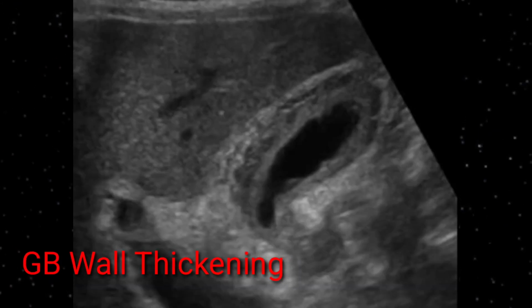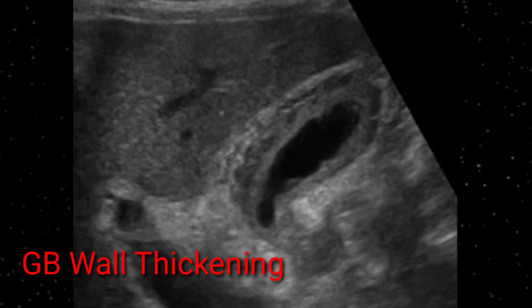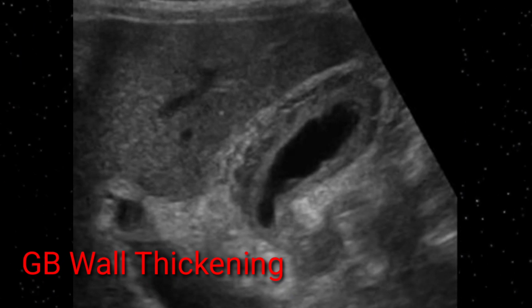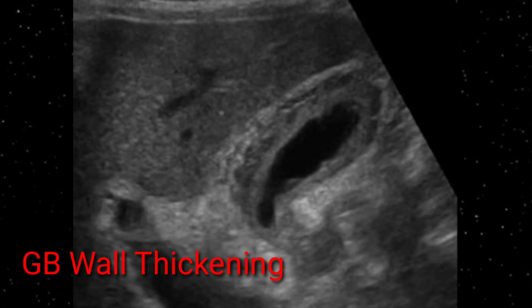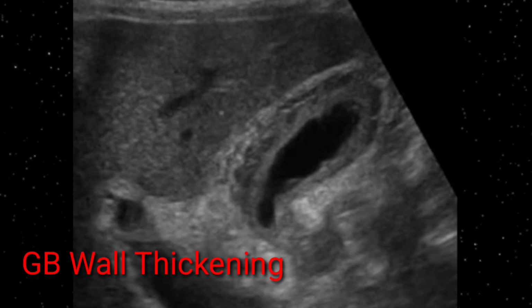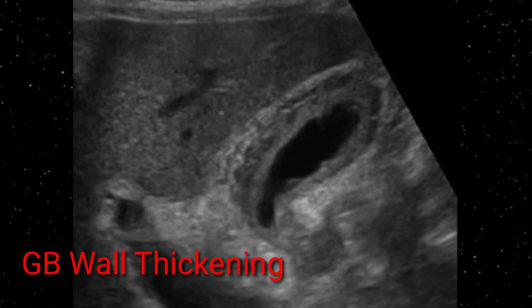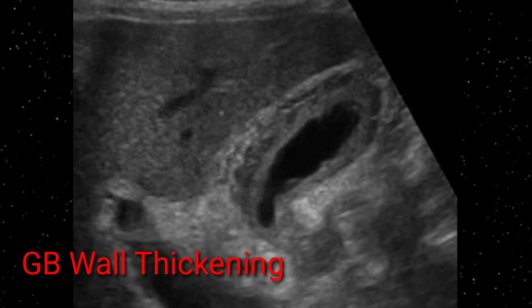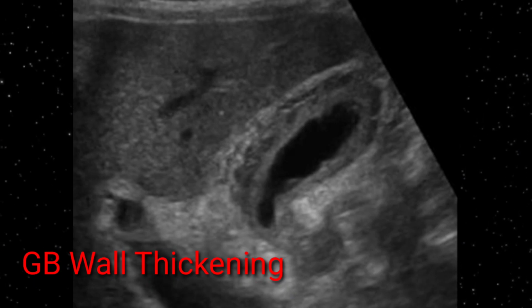On this image, you can appreciate there is thickening of the gallbladder wall. This thickening of the gallbladder wall is due to two reasons. The first is edema, because of ascites, so an edematous wall because of ascites, and second, due to cirrhosis. Gallbladder wall thickening is usually seen in fully developed cirrhotic patients.